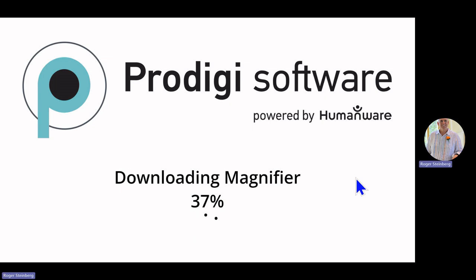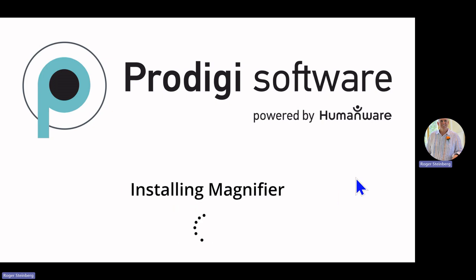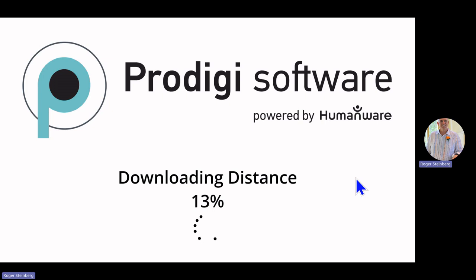It will download multiple applications here. So you saw it downloading OCR, some text-to-speech. Now it's going to download the applications that are found in the Prodigi software. So right now it's the Magnifier, but it will also install a distance application and a files application to complete the process. So we'll let that run its course here.